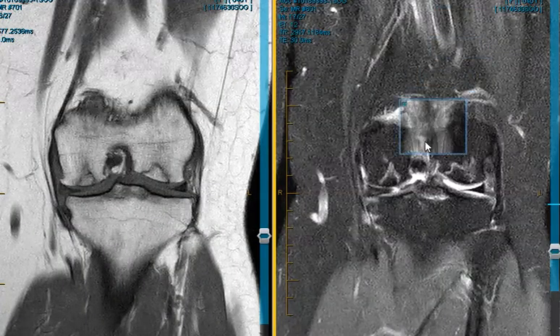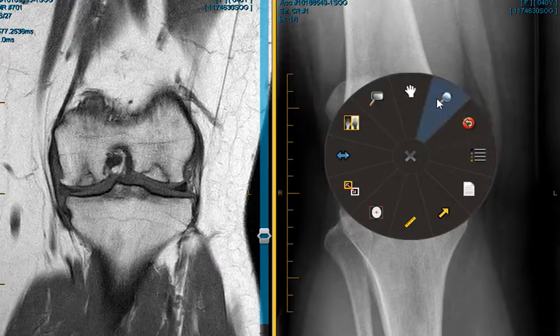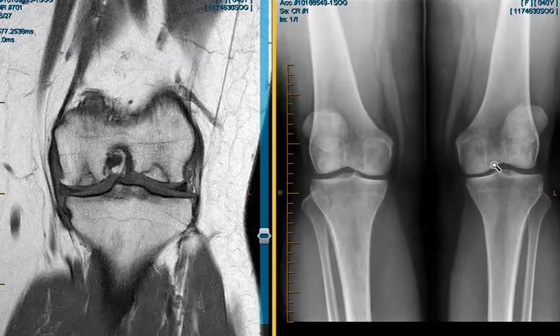And again, in retrospect on x-rays, it looks like the patient probably does have AVN of the opposite side because both sides have increased density of the condyles.